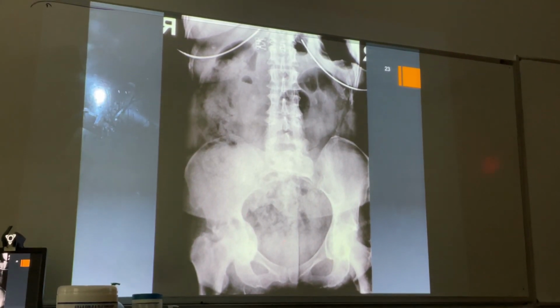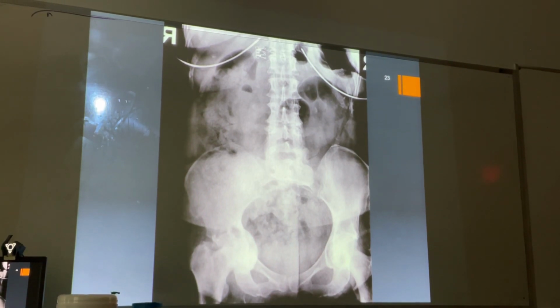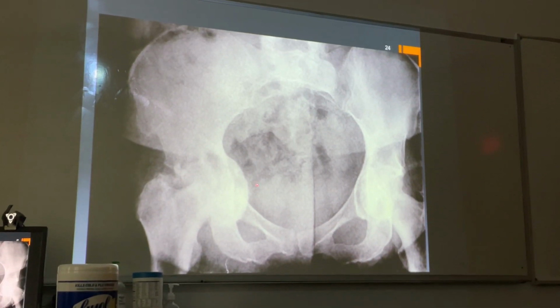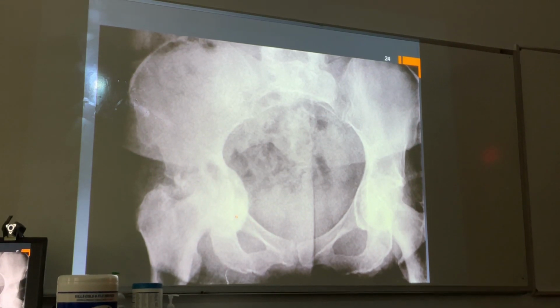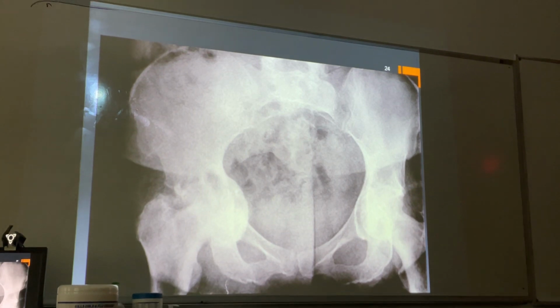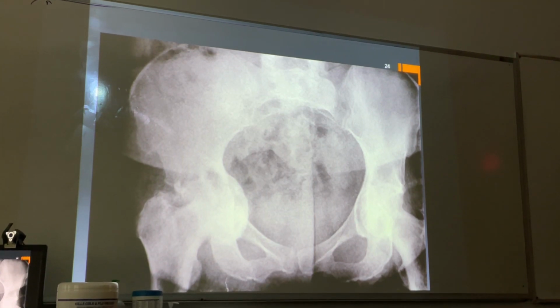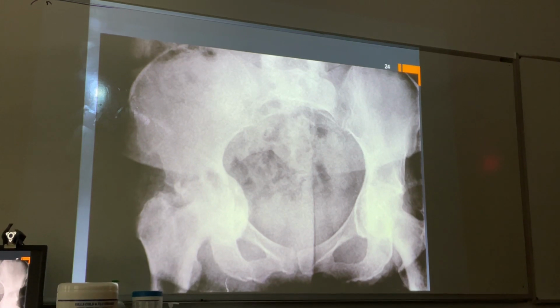Now, it's not affecting bladder, all right, but you would think this patient would have gait abnormalities. That's just a close-up of it. So this line is intact, even though it's covered by the displacement, the protrusio, but the ilioischial line is the culprit. It can't take that blow, okay? So it's the dashboard, okay, and that pushes, and it goes the path of least resistance, which is laterally, or if it goes the other direction, it's going into the anatomic pelvis, okay?